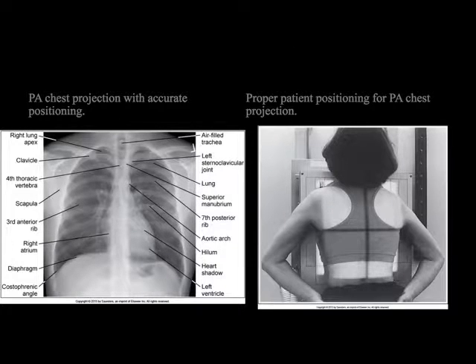As we're looking at thoracic viscera, this is one of the primary views that we'll be talking about, and this, of course, is a PA chest projection. One of the reasons we use PA is increased protection for the patient. We're essentially shielding their thyroid with their body. One of the main things we'll look at to distinguish it from the AP is the size of the heart, as well as the projection of the clavicles. We'll talk about that a little more, but just note the proximity of the clavicles below the apices on this projection.